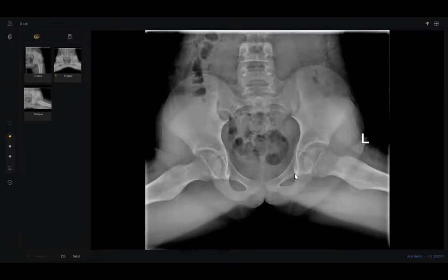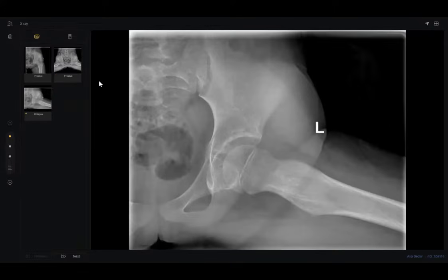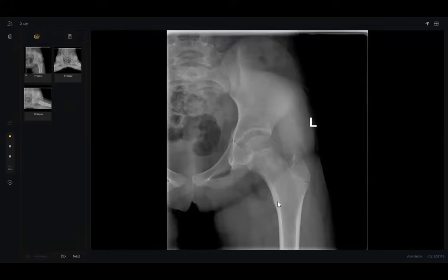Okay, what happened here? Sclerosis here at least. By comparison, this area is more sclerotic than the right side. So enumerate the different causes of focal bone sclerosis. Okay, stress fracture, but a stress fracture should be more horizontal. Second, osteoid osteoma, it's very important. Third, Ewing sarcoma. Fifth, whatever infiltrating tumor.